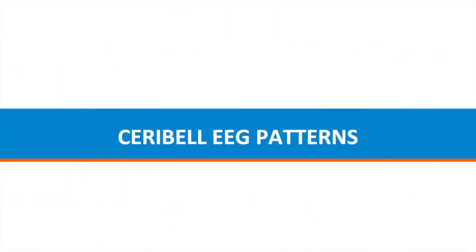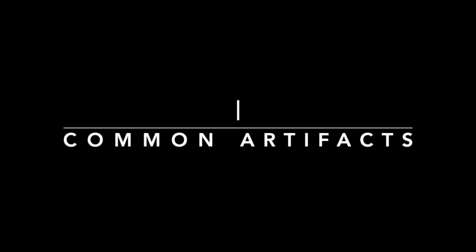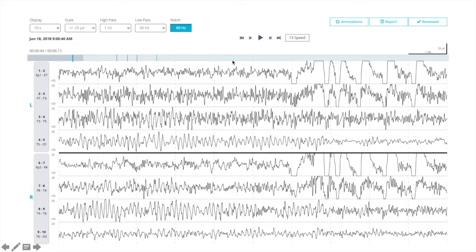In the next few short clips, I'm going to be reviewing some EEG patterns that you will be encountering when you start using Ceribell. I encourage you to complete the training module and familiarize yourself with all the features of the portal.